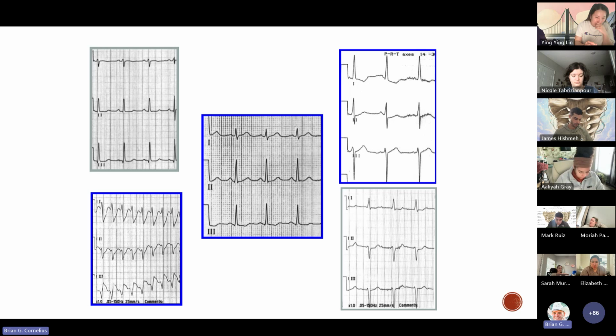So I'm thinking right now it's probably going to be something that's originating a little bit lower down in the ventricles, right? So lead one is primarily down. Lead two is upright. Can we agree our R wave's pointing upright for that patient? Okay. So now I'm thinking it's probably a right axis deviation. And then when I look at lead three, which is also upright, it confirms that for me, right? So does that make sense to everybody? Just using those three leads, I can figure out that this is a right axis deviation.